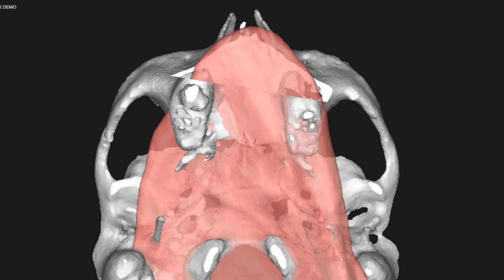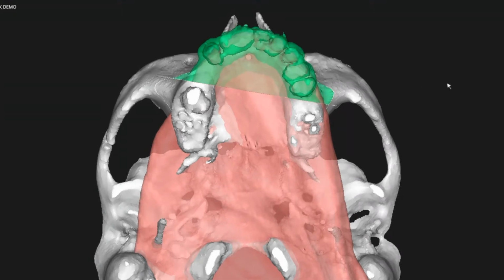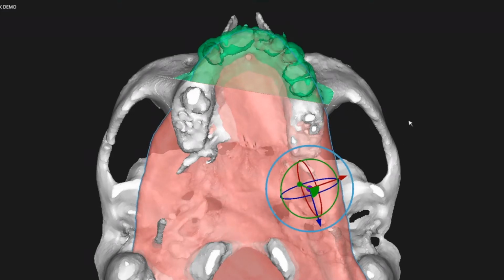Any adjustments needed to the positioning of the scapula now that you're seeing that new resection? On your left-hand side, as if you're looking at it on your right-hand side, looking up, I'd bring that resection a bit more posteriorly.